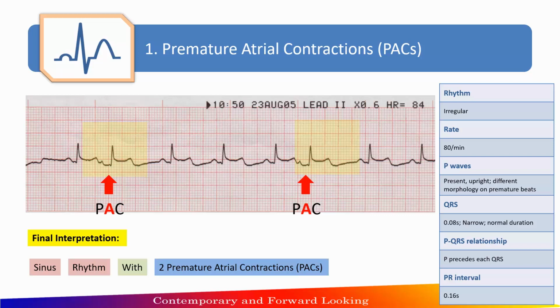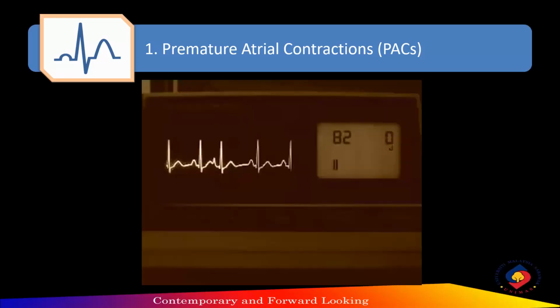When interpreting rhythm strips, it is necessary to review the findings of the 6 steps of the rhythm analysis. Missing any points could lead to a wrong interpretation. Here is how a rhythm strip with PACs looks like on a cardiac monitor.